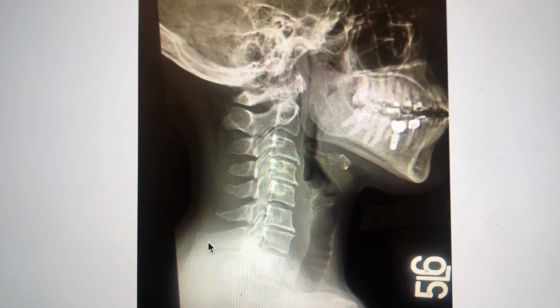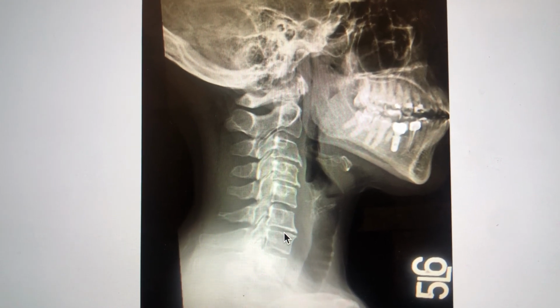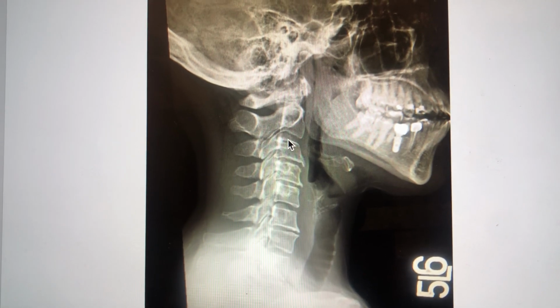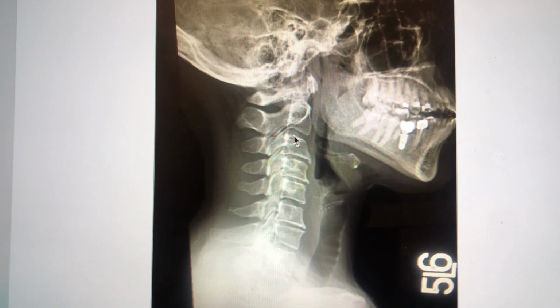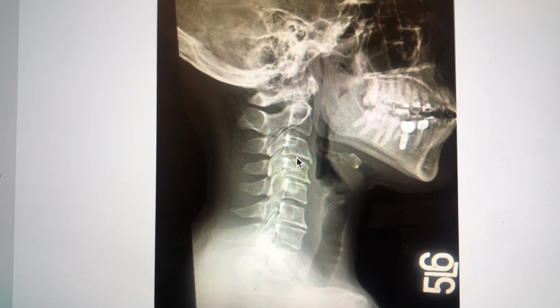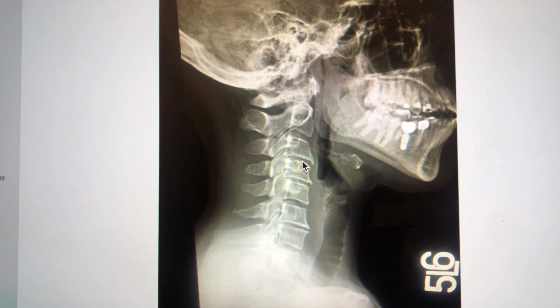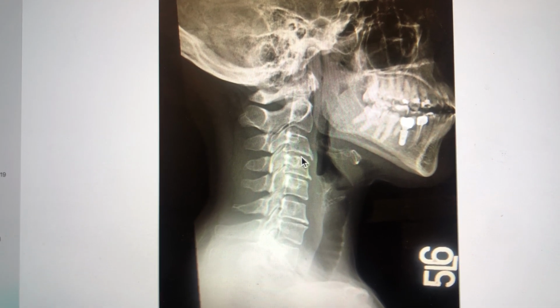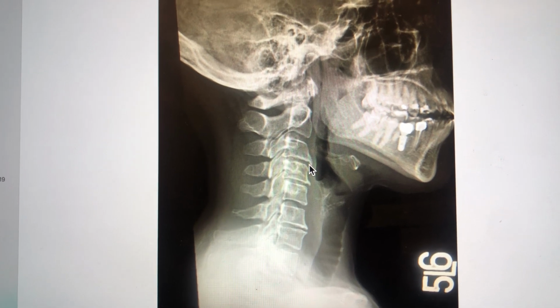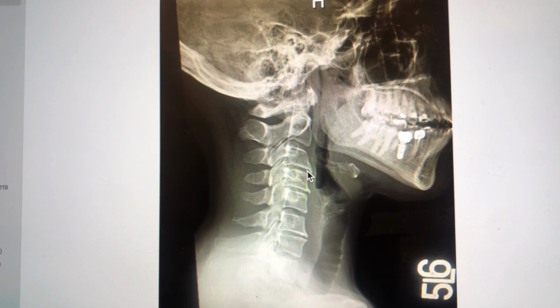Everybody has it. And in terms of these vertebral bodies, you can see that if we go up towards the top, this disc space between these two vertebral bodies has a pretty good height. This height of this disc is less, so it's partially collapsed as part of the degenerative process. When they collapse, there's more stress on the bones, and the bones become more dense, and that's reflected in a more white color on the x-ray there.